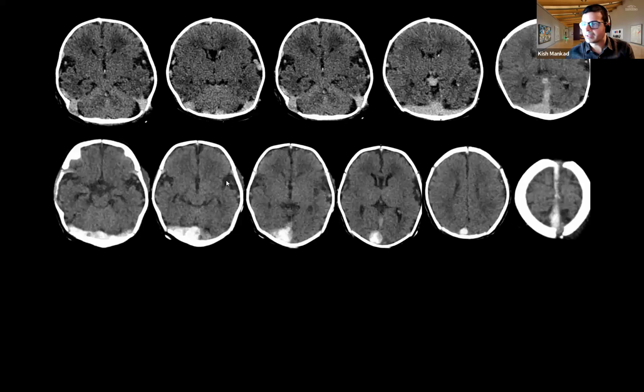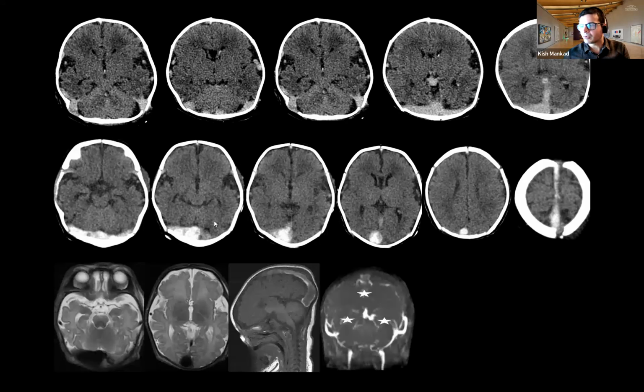And whilst we can see that the cerebral swelling has resolved on day 9, there is increased density of the thrombus. And then what we do is an MRI. So we hope that MRI is the messiah, the ultimate diagnostic tool, but it is not. In fact, MRI is filled with even more pitfalls. Generally, what you would see in MRI is this kind of dark signal on the T2, like you see in these blood vessels, in the arteries, and that is called flow void, which means that there is flow and it's a flow related signal.